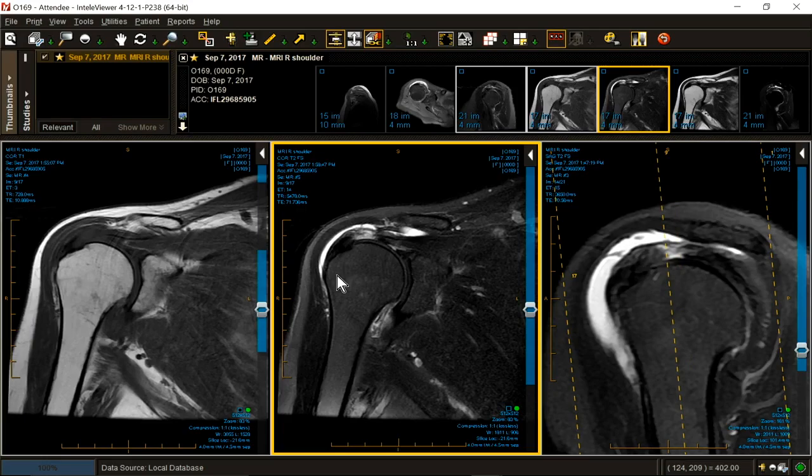But as a general rule of thumb, they don't go together. Especially when the cuff opens to the outside, the fibroinflammatory reaction can decompress. This is probably one of the few examples where the two are coexisting.